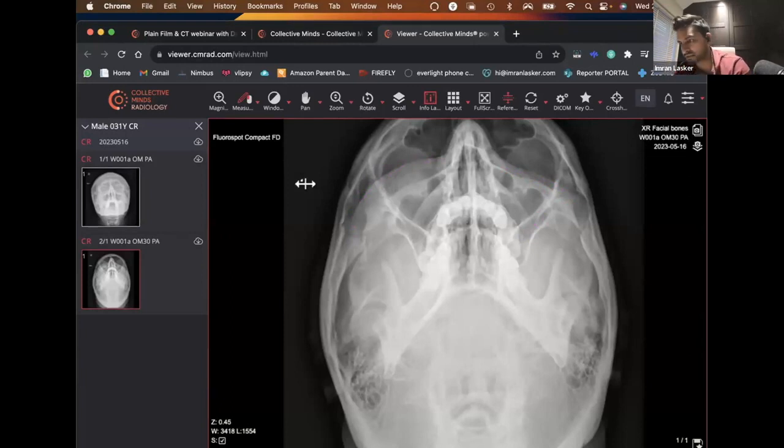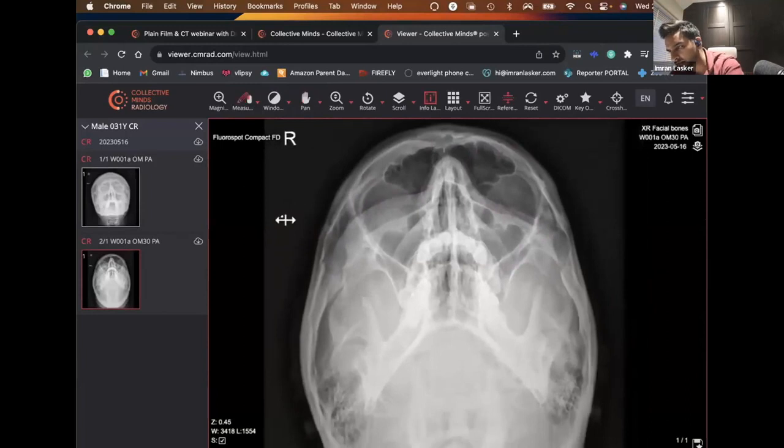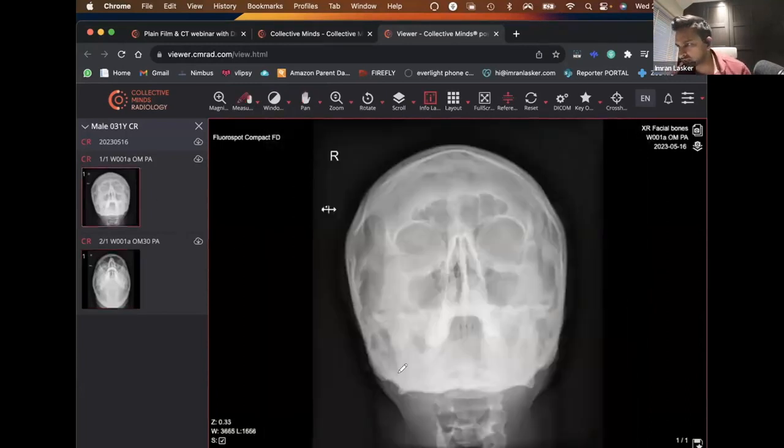region. Someone said, let's have a look, mucosal thickening within the frontal sinuses. Is that right? Frontal sinuses are over here and over here, and they look pretty good. Let's go to this one and see whether we can see any definite mucosal thickening. I wouldn't really bank on it, personally.